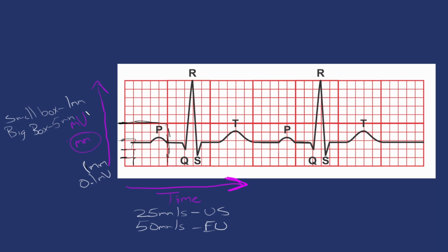Okay. And a good example of why that's not always right is that if you have, say, telemonitoring or something, and you change the amplitude on this or the gain, you set it to like 2 times so you see things better. This might be up here, right at the top, but that's not necessarily 1 millivolt of energy that's going through it anymore. So that's where things get kind of weird, and I don't like using that. Use the millimeters as opposed to millivolts.